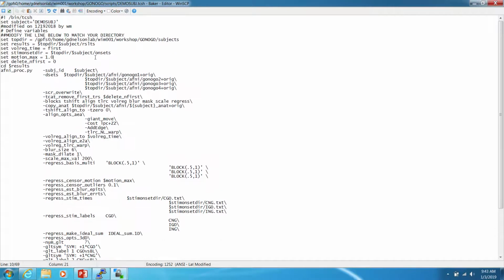The other thing that you often have to do, especially when you're first starting a study, is you'll get everything set up and it won't go, it'll crash. So you kind of have to go into the guts of it to see where it is going, and make sure that everything is set exactly the right way. Yeah. The first time there's a lot of errors. Now our demo set works perfectly. Right. I should make a harder set that just has some errors in it, but I took pity on everybody, so have a good example there.